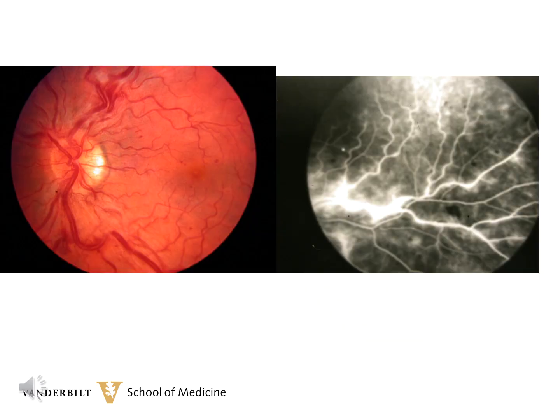This is a very specific style of interstitial tissue staining of fluorescein. This patient has a vein occlusion, and the tight junctions of the major veins are breaking down, and you can see leakage from the veins, and it is staining the tissue around the vein. You can see this type in any condition that will break down the tight junctions, which could include vasculitis as well as vein occlusions.